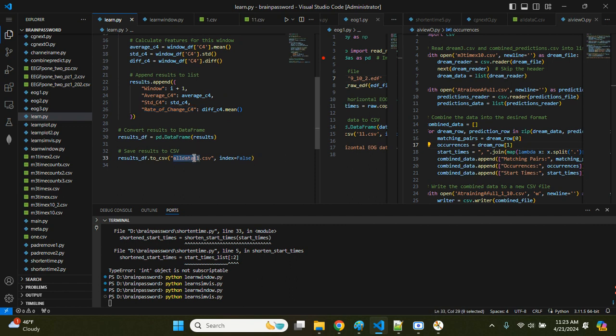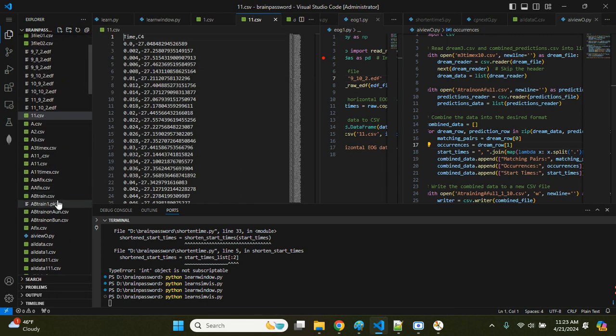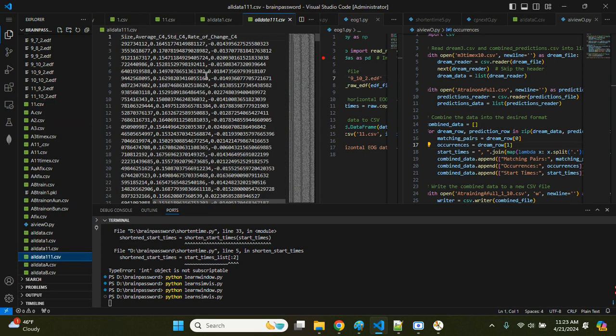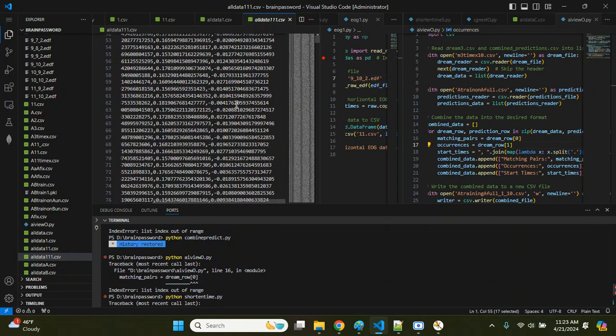And this should be, oh yeah, this file. I never showed you guys this file. All data 11. All right. Here we go. If I did show you guys, I showed you for a little bit, and I got this at the end, and I think it's this data. And this is what we are visualizing.